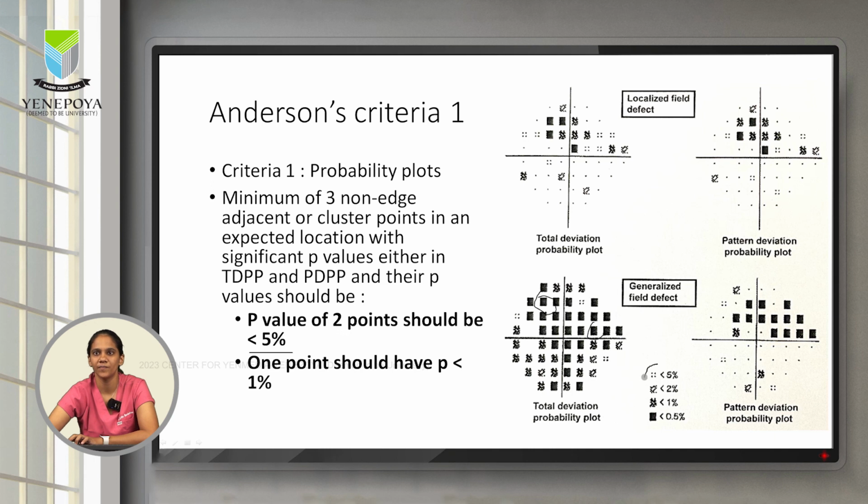This 4 dot, even that is dangerous, okay? So how do you diagnose that? You use a minimum of 3 non-edge points. This we keep hearing, non-edge points, meaning in a 30-2, please remember that, in a 30-2, 3 non-edge points. All these edge points are not considered, forget all of these points.